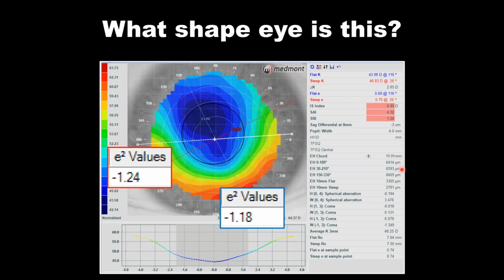Now, I don't know if I trust that it's exactly 6,000 microns. We really need a composite topography here to have an appreciation of this peripheral corneal angle and how that may run into the sclera. Doing a composite would give us much better perspective, but certainly the estimated height attribute is suggesting to you in your scleral lens set, do not choose the median sagittal depth.